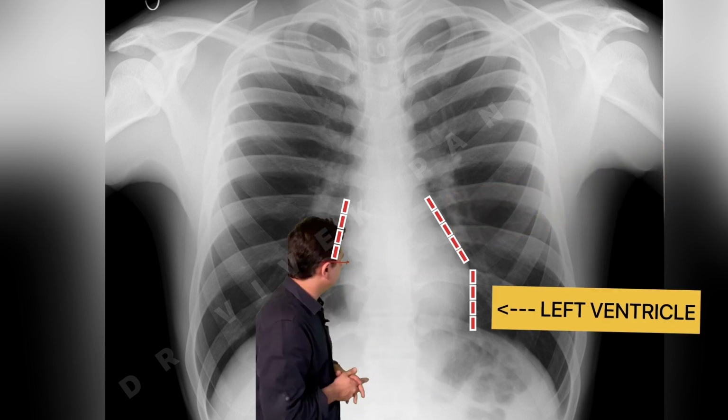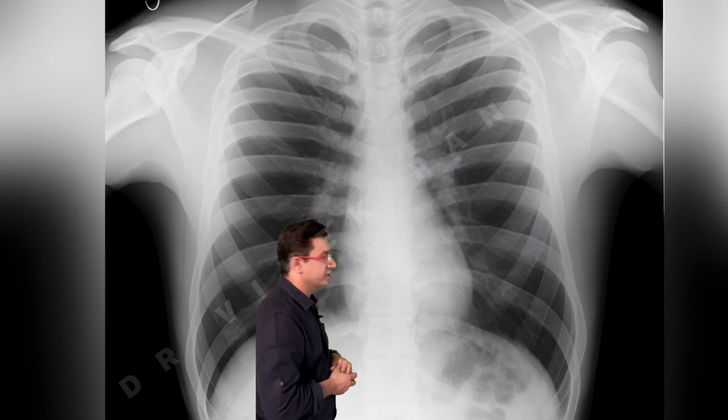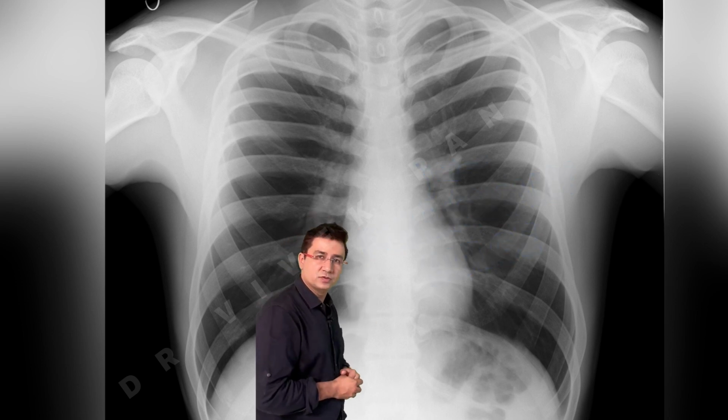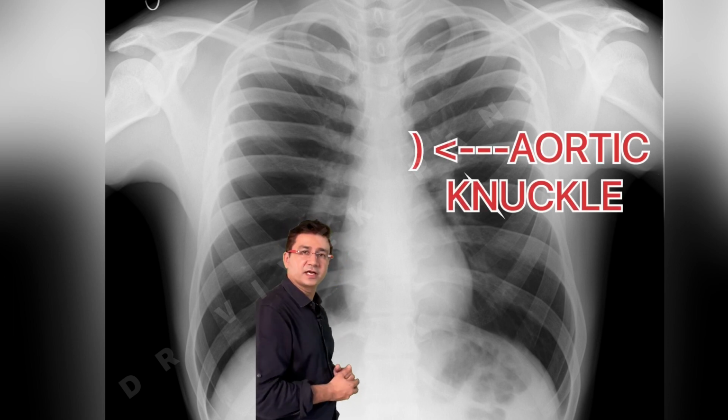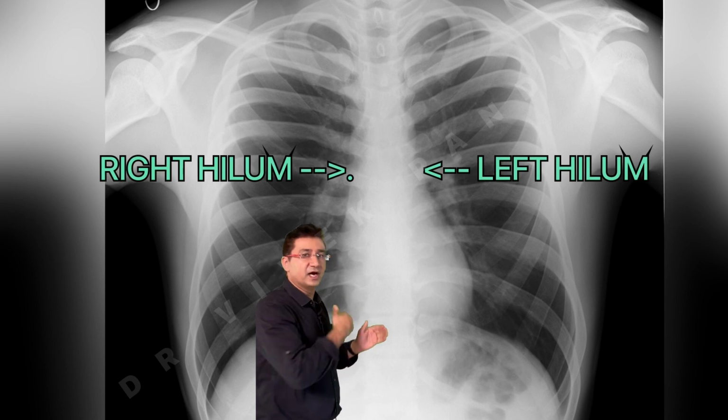In the upper part of the left heart border, there is a slight bulge, which is known as the pulmonary bulge. The pulmonary artery gives that shadow. Above that is the aortic knuckle on the left side, then both hila on either side.